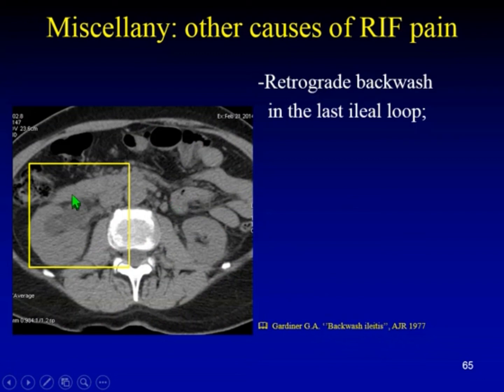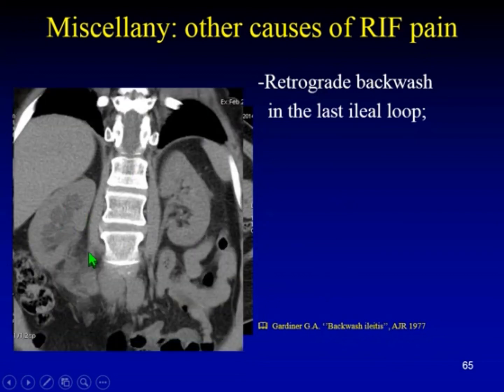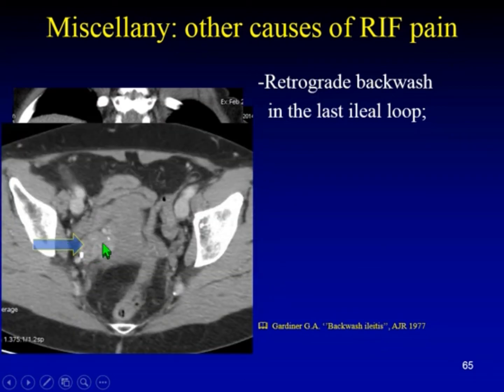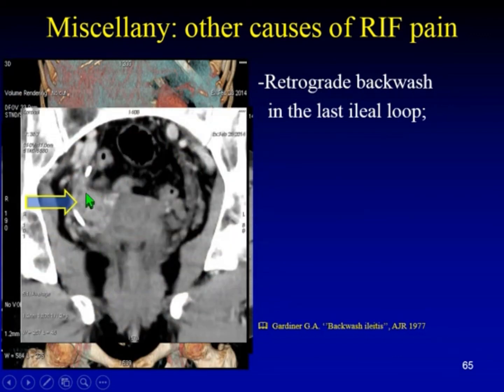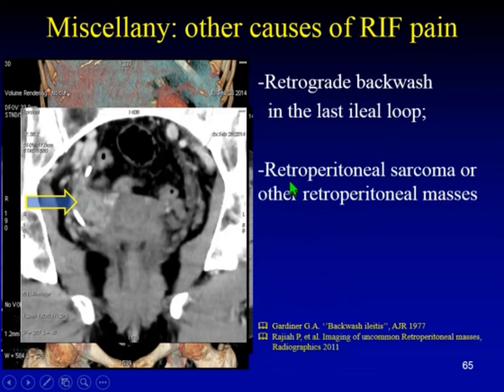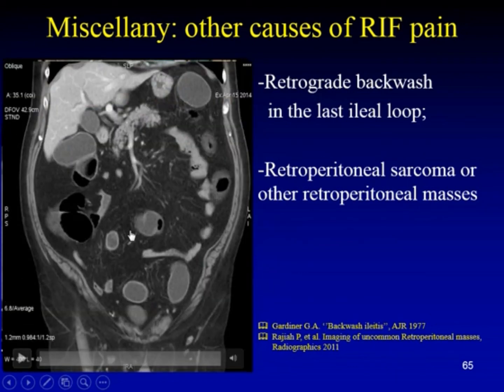Second case, a woman, she arrived with a sonography showing right-sided hydronephrosis. We confirmed by CT, but we performed a contrast-enhanced CT, and we found these small masses, right-sided, near the right ovary. The problem was solved with the stenting, but the lesion was still there. We were doubtful. We were not able to complete our diagnosis. We waited for the surgeon. And the surgeon, please take care of this pathology, found a retroperitoneal sarcoma. This is a very uncommon finding, but able to cause problems like hydronephrosis, and it was an oncologic problem of main importance.